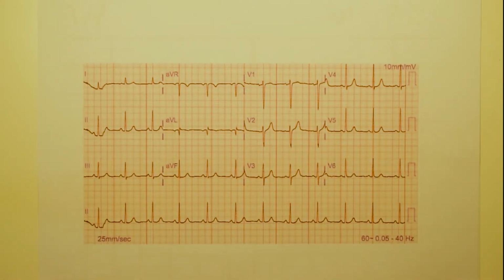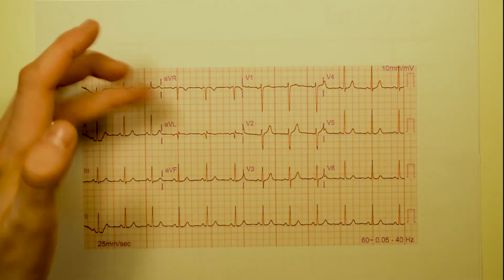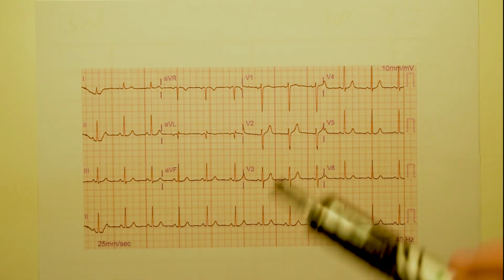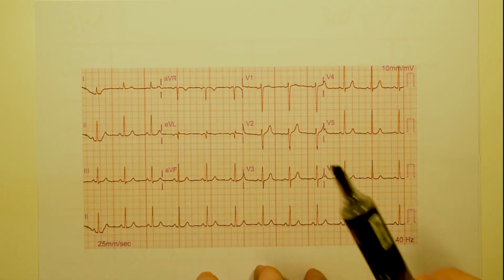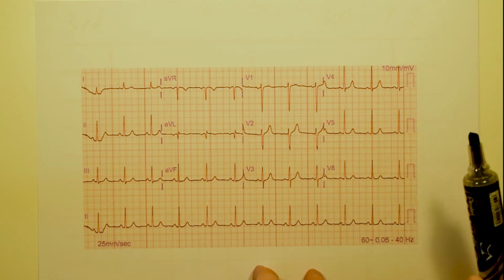So the first time you look at a 12 lead ECG, you're going to feel rather overwhelmed because there's just so much going on. But all you really need to know is that there are 12 leads, so there are 12 different views of the heart. Each view is from a different angle, and some views look at the same angle. So it is important to know that you have to find 2 leads that are looking at the same place, that are saying the same thing.